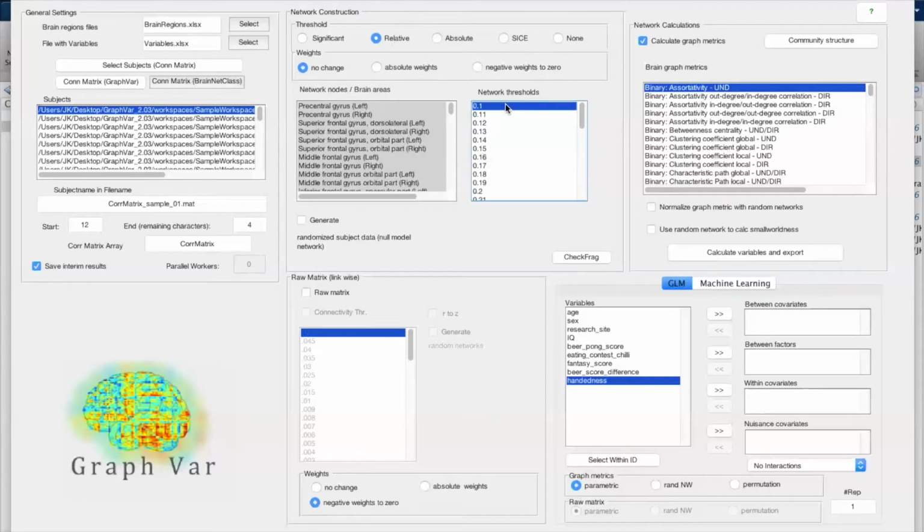And this is exactly what I just said. So here 10% of the strongest links would be maintained for each individual. And it is called normalization because if you look at each individual separately and you just maintain the 10% strongest links and you assume that everyone starts off with the same amount of regions, then you'll also have the same amount of links.